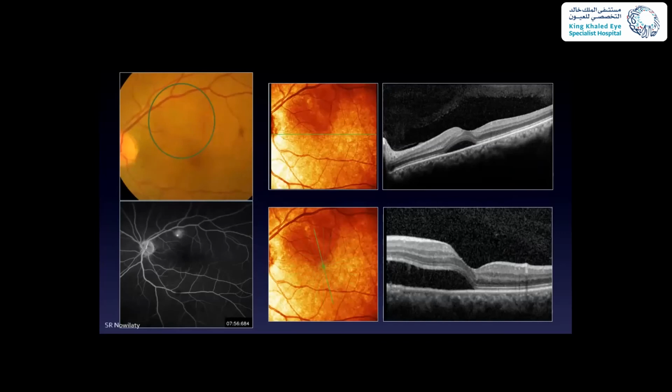And here's an example of a patient who had central serous chorioretinopathy. Here's the pocket of fluid right there, you can see it on the SLO image. And here was the leaking spot that gave the ink blot appearance. And when you do an OCT, right here through the middle, you're seeing the subretinal fluid reaching the fovea. But if you do a vertical scan or a radial scan, you see that the subretinal fluid is much more elevated superiorly than inferiorly. In the inferior retina, she has no detachment whatsoever. The detachment reached the fovea and just detached the fovea.